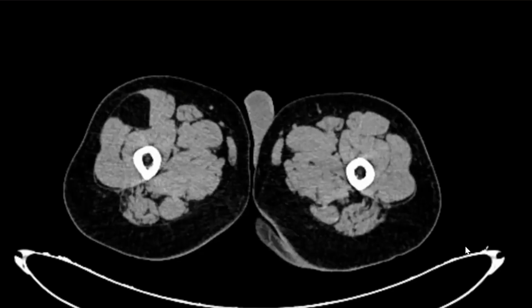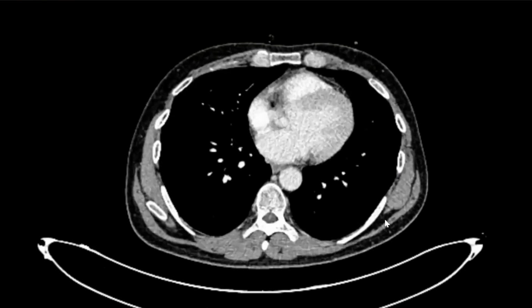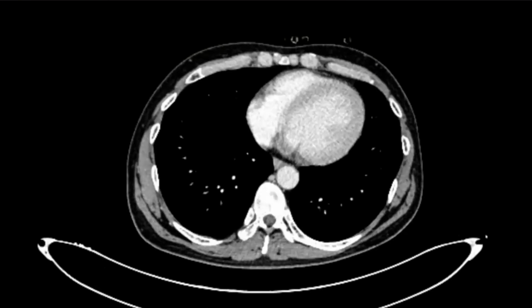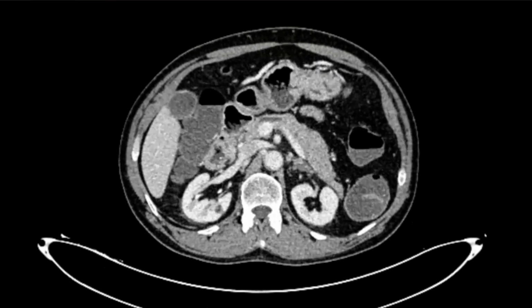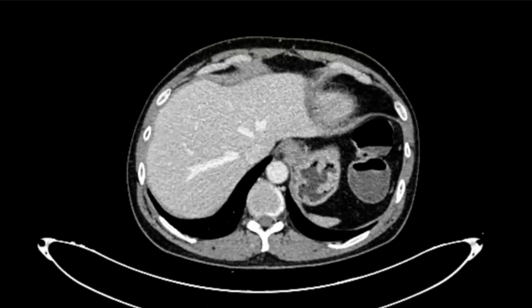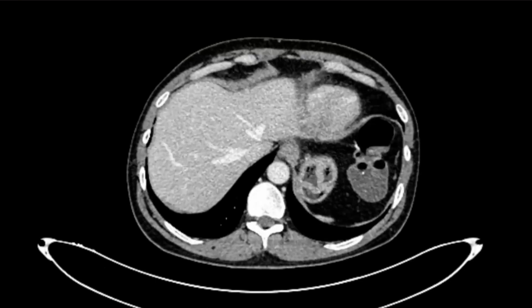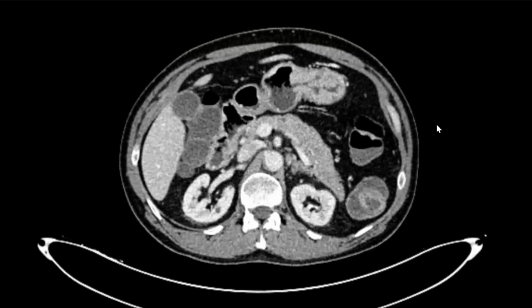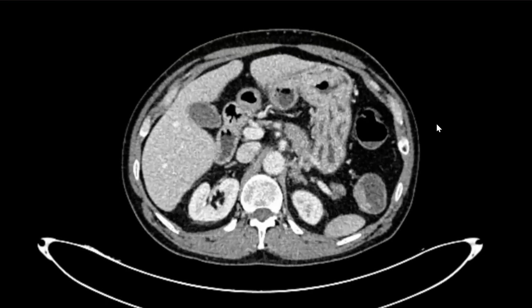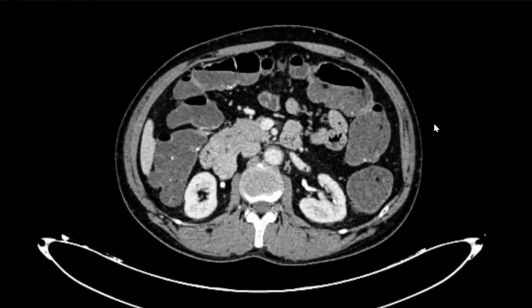You just hold on a second. I'll give you the post contrast images. So, okay, you can scroll. These are the portal venous phase images. As I can see, the liver is normal. There is no intrahepatic biliary duct dilatation or any focal liver lesions noted. The main pancreatic duct appears fine. You can ignore the pancreatic duct.